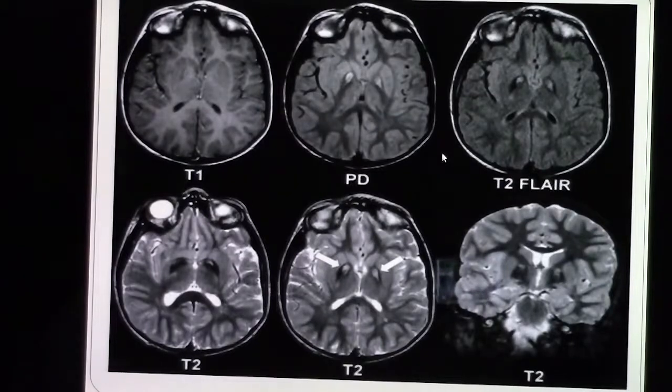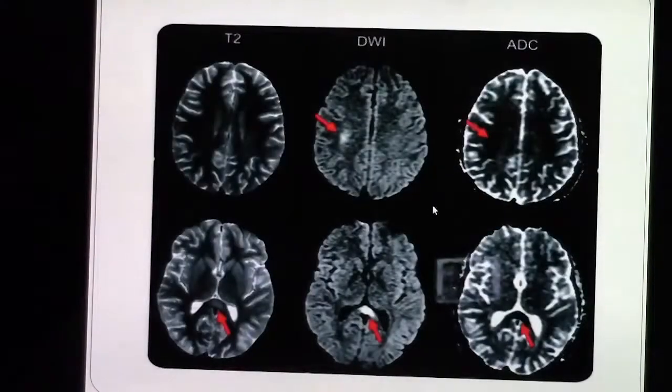There are also more cuts that are used in the brain MRI regularly. These cuts like diffusion weighted images. These are the cornerstone cuts that we use to diagnose acute stroke. And as you see here, acute stroke or restricted diffusion would look bright.